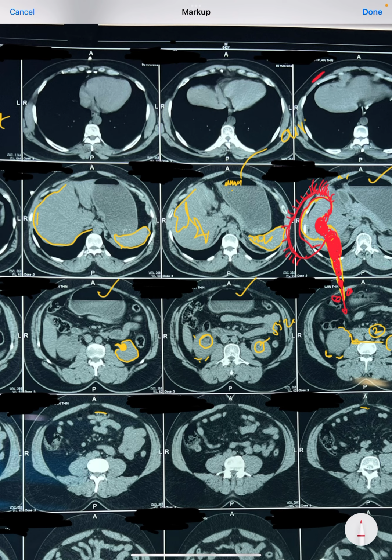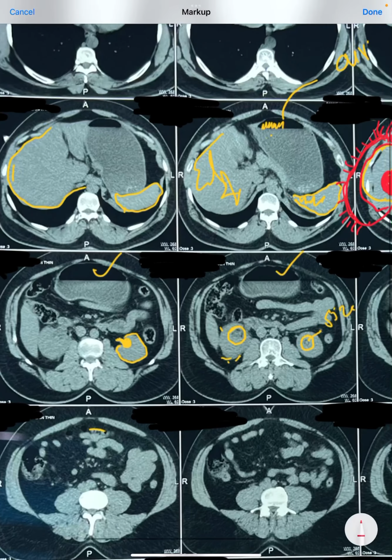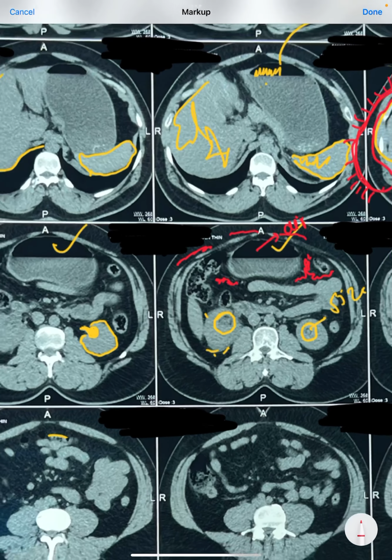This all is fat. Okay, this is abdominal. This is above the abdomen fat. So around the kidney, this is all fat. This is all fat. The black structure is all fat. This is dense black. This is air, and lesser black is this fat. This is all fat. This all is fat. So you'll see white linings inside that will tell you that this is fat.